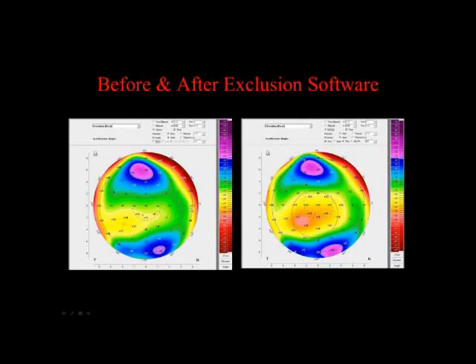And it's important to understand what all the circles mean. So again, we're showing you here a 9mm zone, so we're limiting it to 9mm. This big outer circle represents the 8mm zone, so we're using all the data within the 8mm zone to compute the standard reference surface. The dotted lines here are just the pupil. This is now the enhanced reference surface, the same 8mm zone, the same pupil, but this represents the exclusion zone. You'll notice that mark here that represents the thinnest point of the cornea, so we're excluding this area from the reference surface computation.